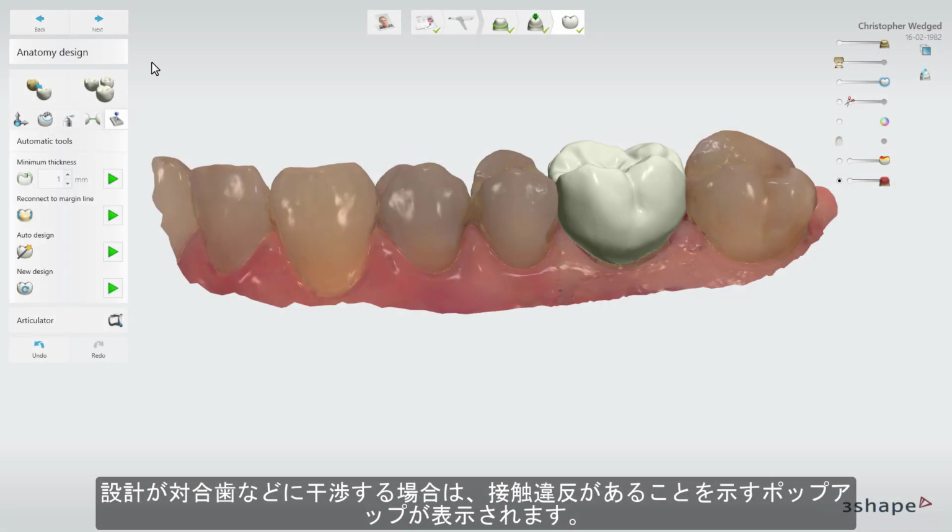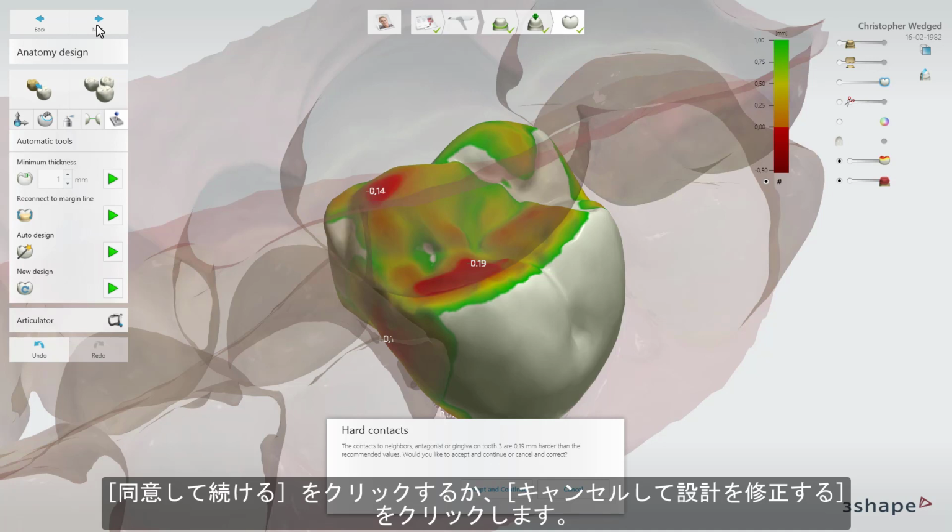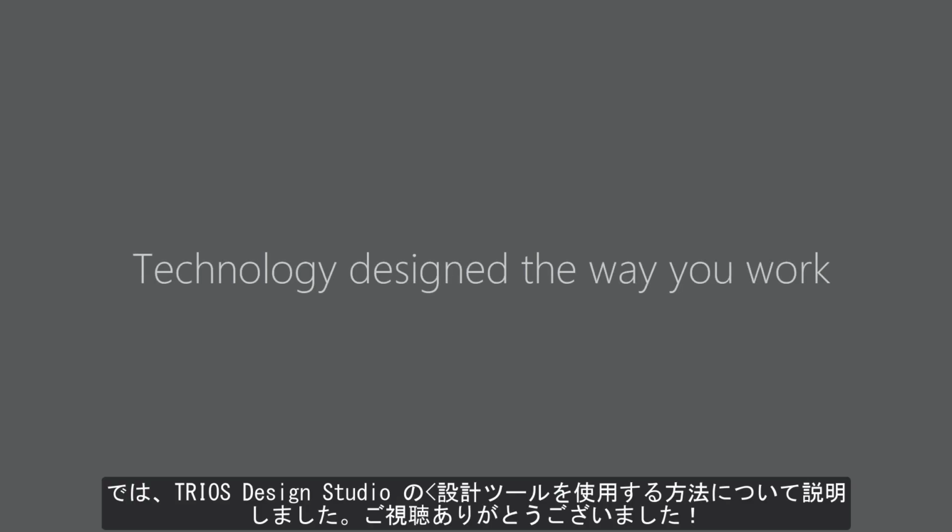If your design collides with the antagonist, you will be informed by a pop-out that there are hard contacts. You will be given the option to accept and continue, or cancel and adjust your design. Now you have learned how to use the design tools.